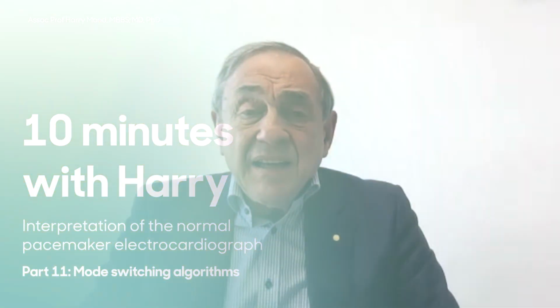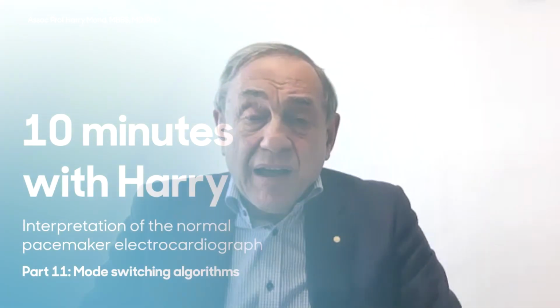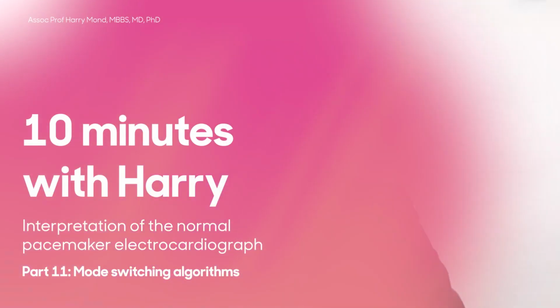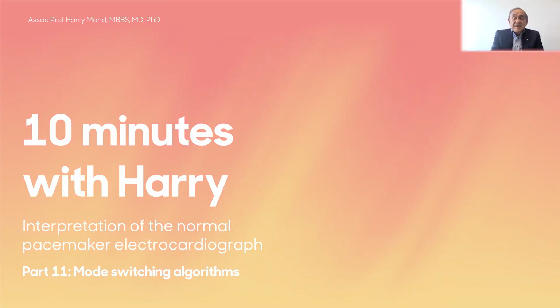We are currently looking at the pacemaker electrocardiograph. And today I would like to discuss with you mode switching. We are currently showing ECGs in the pacing series, and this is number 11, mode switching algorithms.